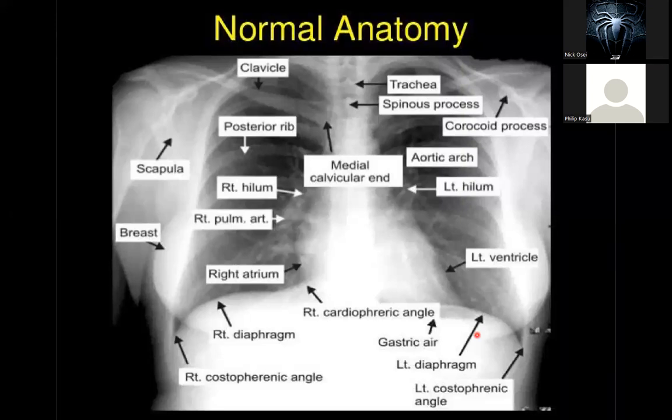Now, whilst we are here, I would like to mention a certain phenomenon where when there is air in the abdomen, such as in typhoid perforation or duodenal perforation, you can see that gas under the diaphragm. Under the right hemidiaphragm, what structure is under the right diaphragm? Somebody. Yeah, somebody. What's under the right diaphragm? What organ is there?